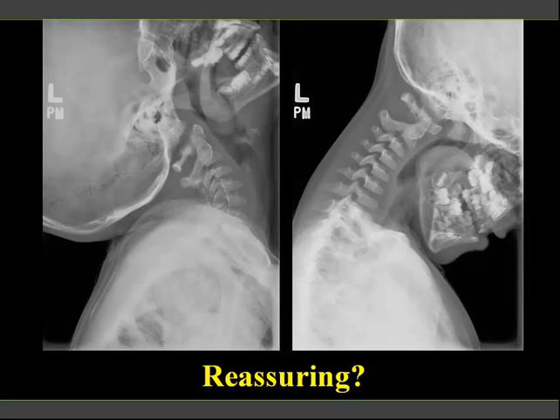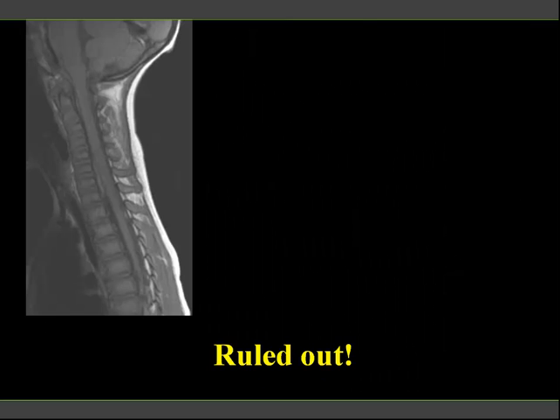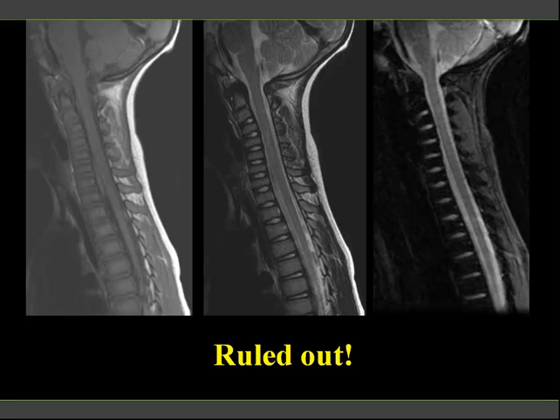So be familiar with the normal appearances of the pediatric cervical spine, including the pseudosubluxation of the vertebrae with flexion. But this patient still had to undergo another cross-sectional imaging because, as I mentioned, SCIWORA, spinal cord injury without radiographic abnormality, is best shown on MRI. This patient had a normal MRI. And finally, the cervical spine could be cleared.